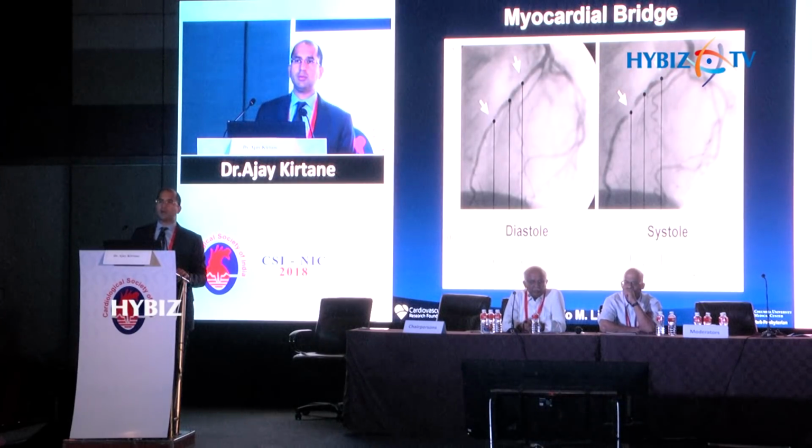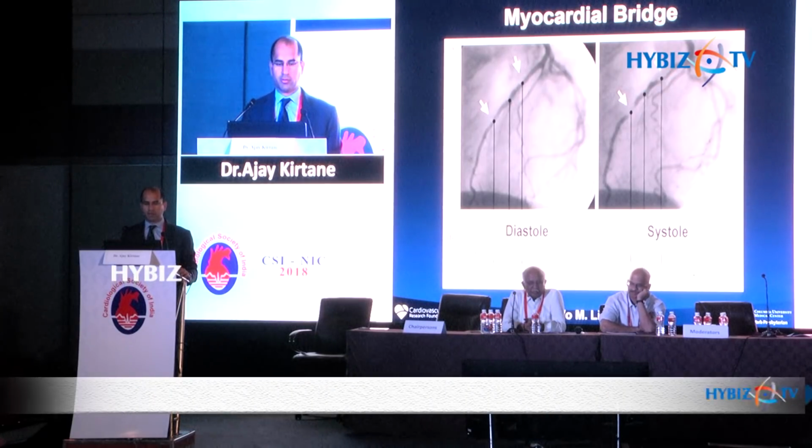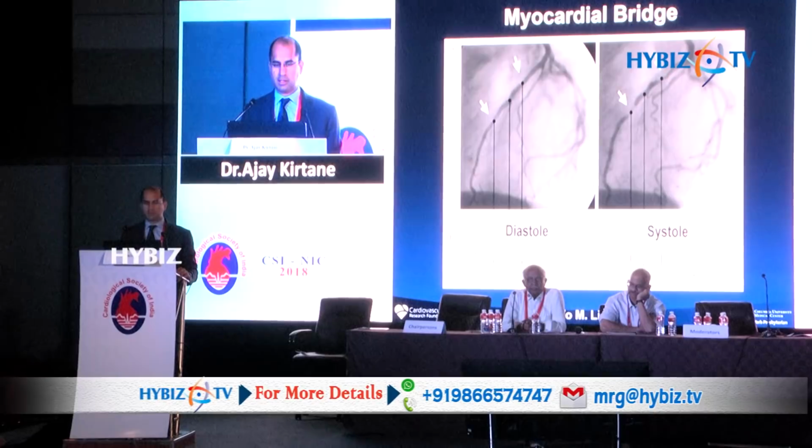Other things you need to be cognizant of are other abnormalities within the vessels. This is an example of a myocardial bridge. Diastole looks okay, systole is compressed.